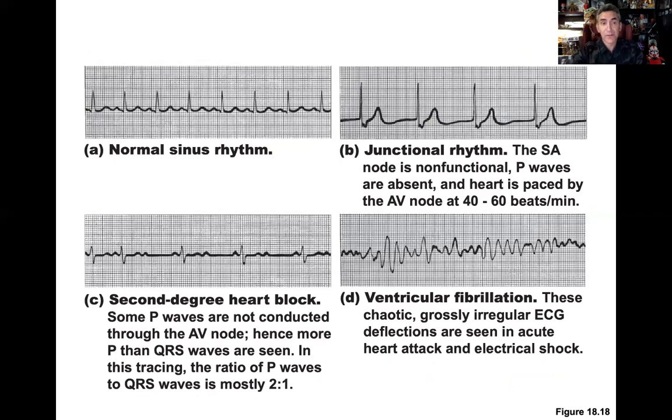So let's start with our baseline, something that you should start to see and recognize as normal, right? So let's start with the normal sinus rhythm. So pretty small, right? And now I'm gonna upload some videos and another lecture on how to interpret what these little boxes and squares mean. But for now, let's just kind of look at what we consider rhythm.